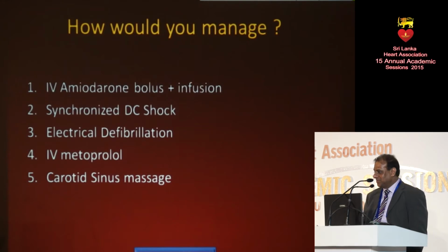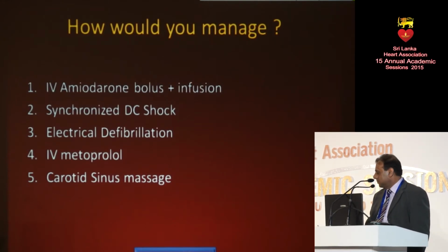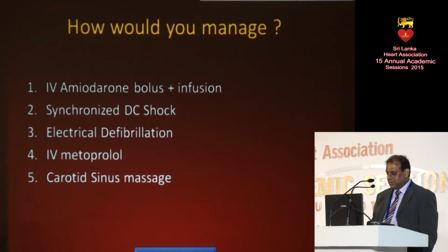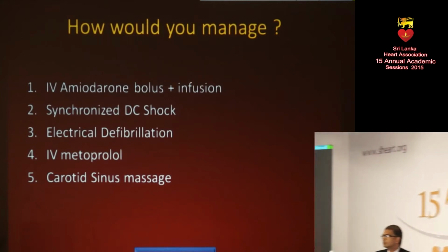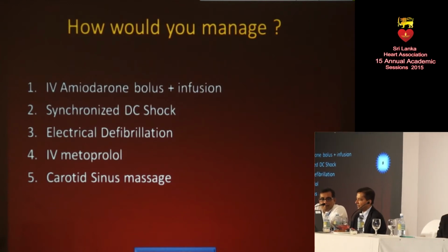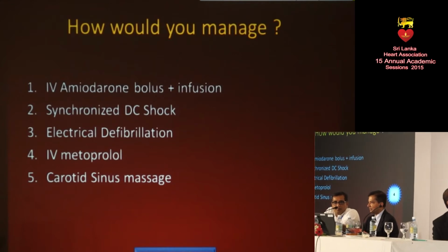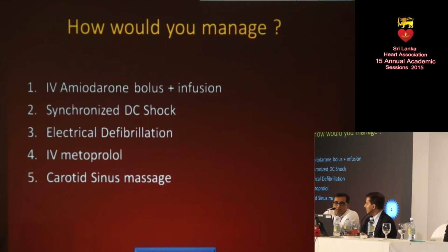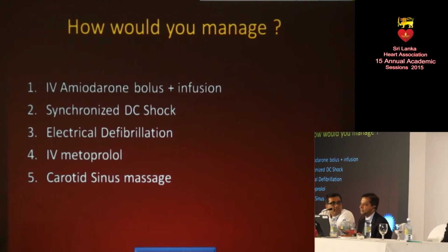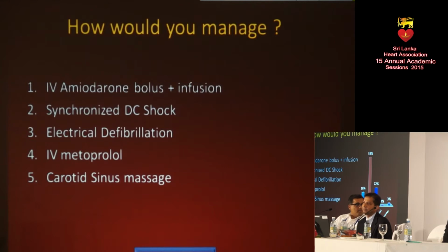So what was the blood pressure number there, Asunga? 90/50. Patient is short of breath and he's sweating. Okay, let's go to the last 10 seconds. Make up your minds now. Okay, so let's see the responses.